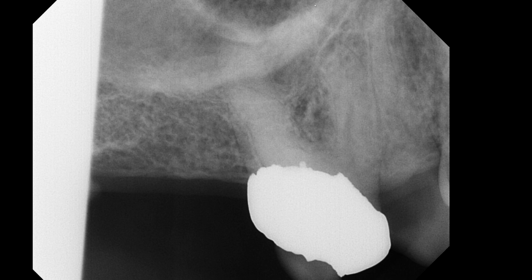Do you see this kind of U-shaped radiopaque border? So that's the zygomatic process of the maxilla. And you can also notice that there's a thick border that extends from the inferior border of the zygomatic process of the maxilla, extending posteriorly. So that's actually the inferior border of the zygoma.